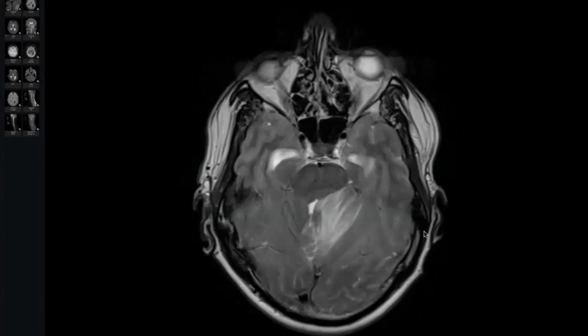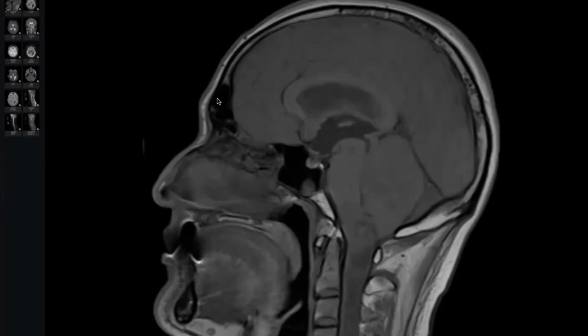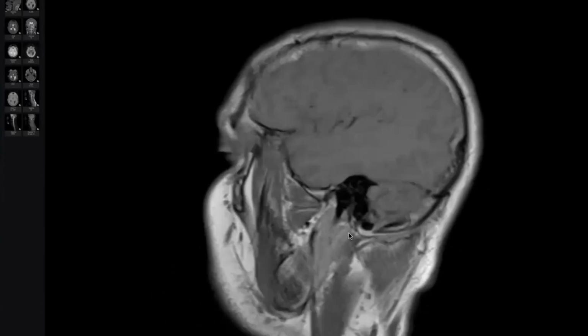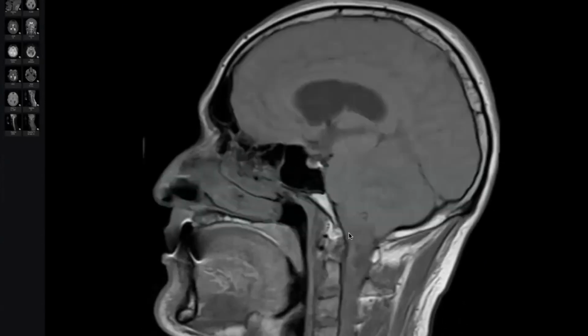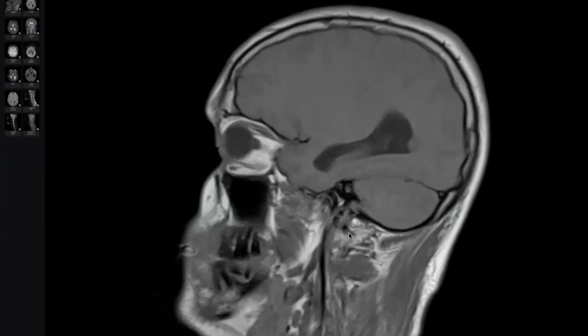But see here, marked compression. I don't know if there is herniation here or not. No obvious herniation, but this case needs at least urgent anti-edematous measures, and then investigation for the other criteria of the syndrome. Thank you, our doctor, so much. Next candidate.